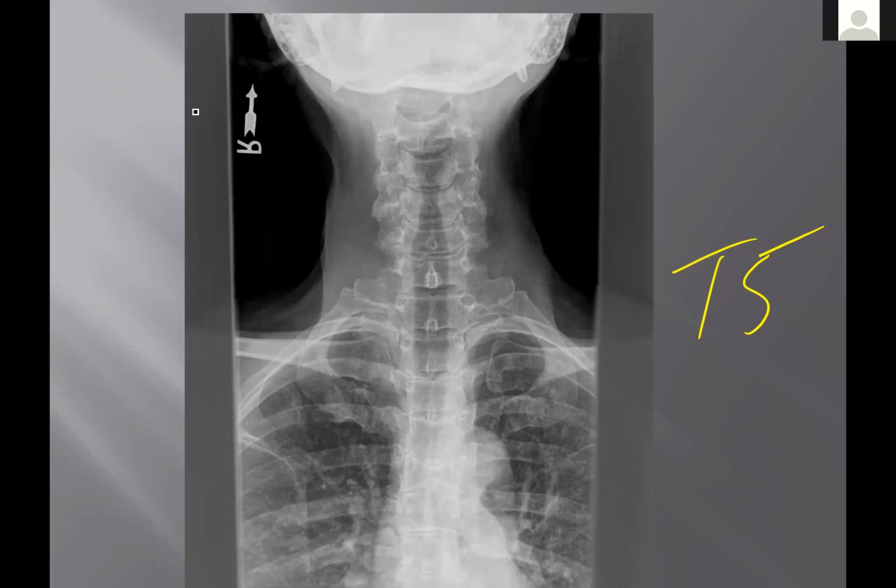Hemivertebra is close, and in fact, this is a butterfly vertebra, but a butterfly vertebra is a symmetric hemivertebra on both sides. So you're right, but take a look at this. That's cool. Maybe only cool if you're a radiologist, but that is an awesome butterfly vertebra. Just came through last week. And what's cool about that is it's not a compression fracture. And that, of course, helps you in your follow-up.